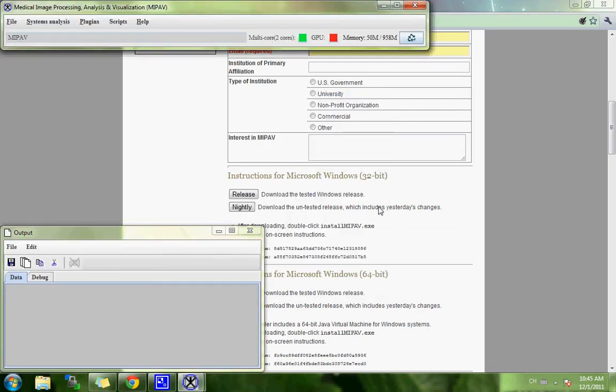Okay, so without any image files open, the Java-based software itself will use at least 35 megabytes. Usually they recommend that you multiply your image file size by 10, and that's about the additional memory you will need to use in your analysis.